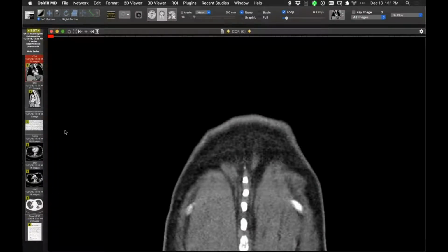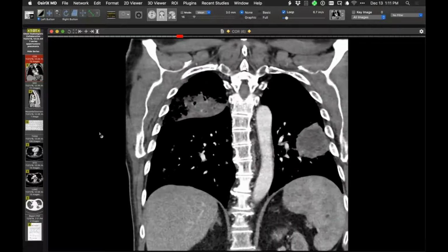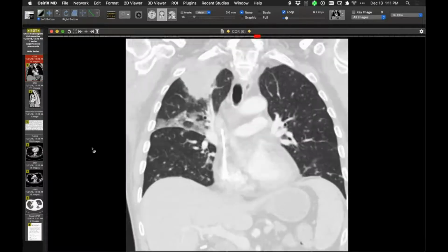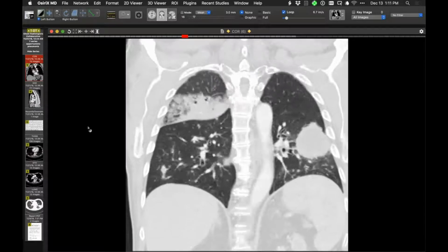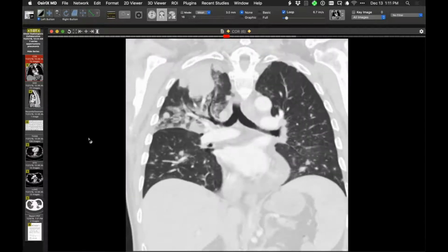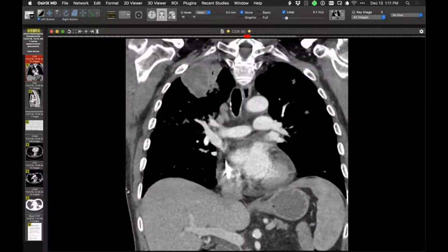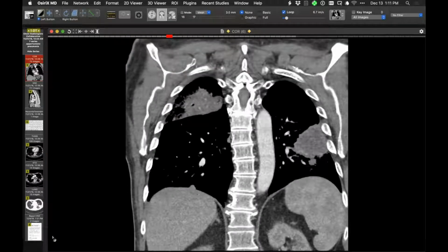This is a case of a patient with a history of stem cell transplantation and the development of extensive pulmonary parenchymal opacities. And of course, some of them are quite large. A lot of them are big, round, nodular lesions in the lungs, as well as smaller lesions. And this is what they look like. They're areas of necrosis within, particularly with respect to that lesion.